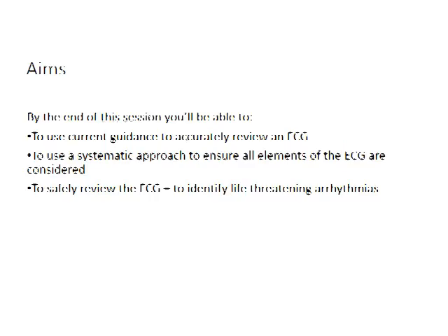Welcome to this session where we will begin to systematically review the ECG. We will look at the systematic approach you should take when analysing the ECG. Remember that in the exam, if you are faced with a life-threatening arrhythmia, then you must correctly recognise this.